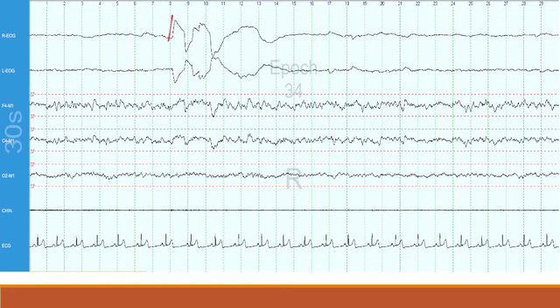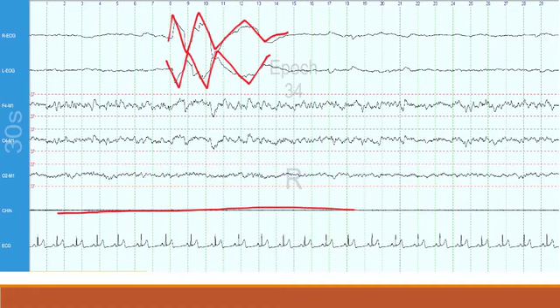We have the rapid eye movements, right? And we see this from the characteristics, it's got to be less than half a second in terms of their deflection time, and then you see low amplitude mixed frequency without K complex or spindles, and then of course you have a very thin line in your chin tone, so therefore it's the lowest chin tone, so we can call that definite R.